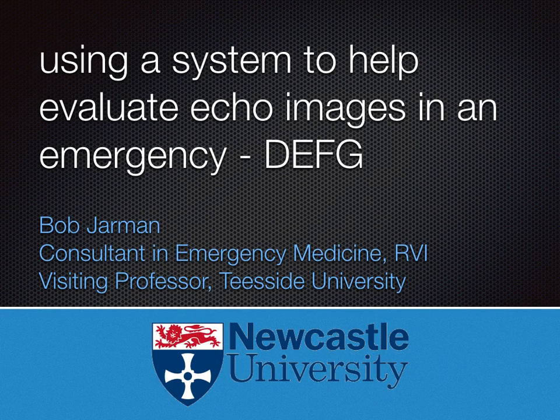Hello, we're going to teach you a system that we've developed to try and help you evaluate echo images and clips, certainly in an emergency situation where time is critical, but managing to get the information from the clips in a shorter amount of time by using a structured DEFG approach.